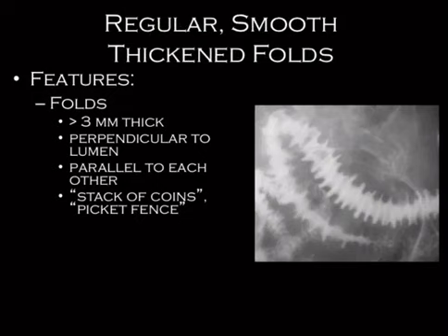Basically, you've got fluid infiltrating into the small bowel submucosa. It's simple fluid. It's not complex fluid. If it was complex fluid, it would look more nodular.